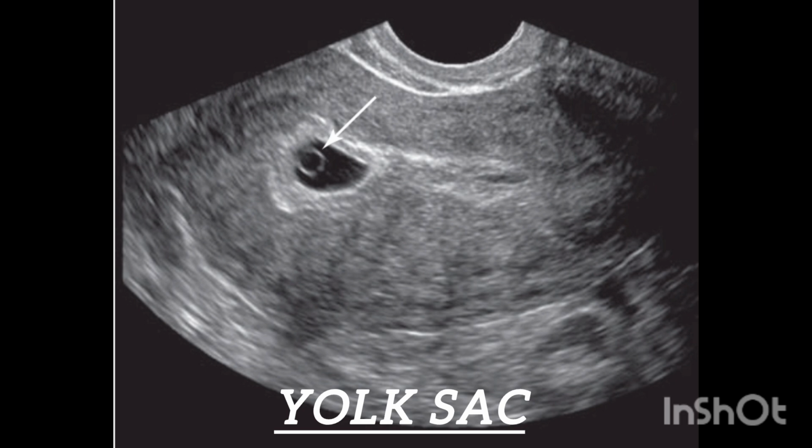Clinically, the presence of the yolk sac is reassuring, as it indicates a viable intrauterine pregnancy. However, the absence of the yolk sac by 6 weeks may suggest an abnormal pregnancy or impending miscarriage.